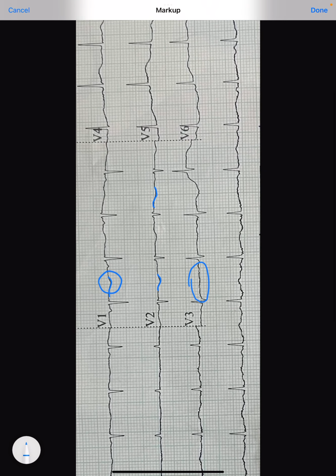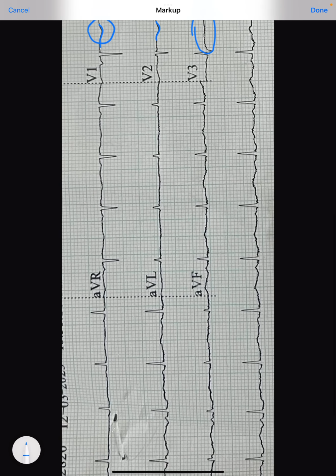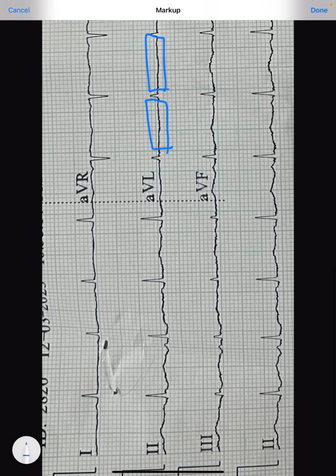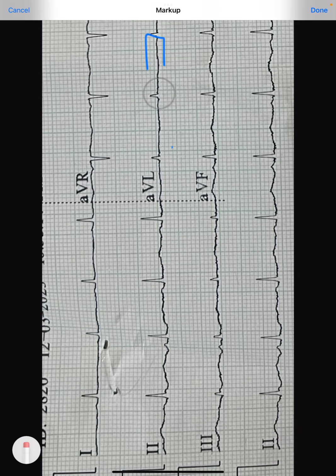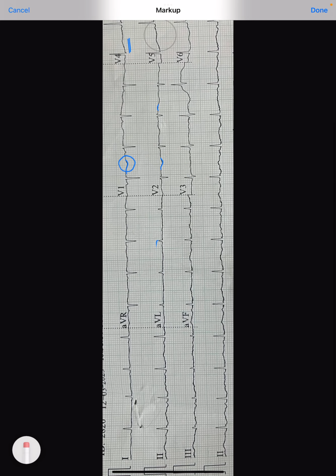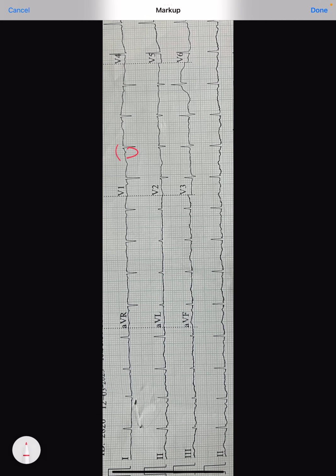So here we don't have a good T wave. Here the T wave is all absent. So in almost all the leads there is no T wave. A T wave should be there, but the T wave is flat. The T wave is not at all there. So low voltage ECG, flat or loss of T wave, flattening of T wave, or inverted T waves is a feature of hypokalemia. The second most important thing you can get in hypokalemia is the presence of a U wave.